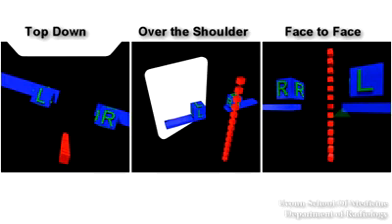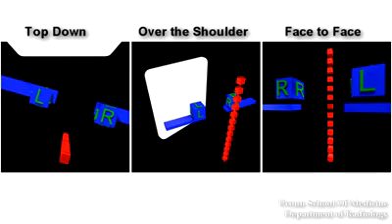If you notice here on this radiograph perspective view, the medial head of the clavicle appears to be closer to the vertebral body than the right side. So this is how you can actually tell if the patient is rotated on a chest radiograph. If you notice that the vertebral bodies or the line of spinous processes are actually closer to one medial head of the clavicle than the other, then you can tell which way the patient is rotated.